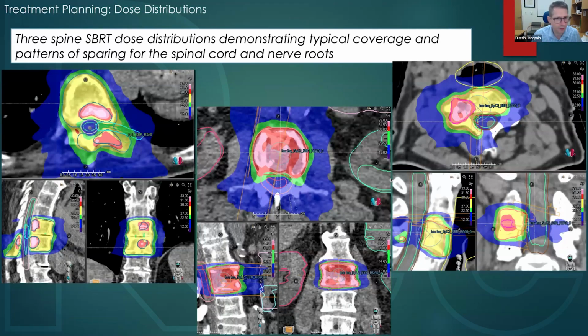So I did something special here. Generally, the target coverage is going to be yellow.